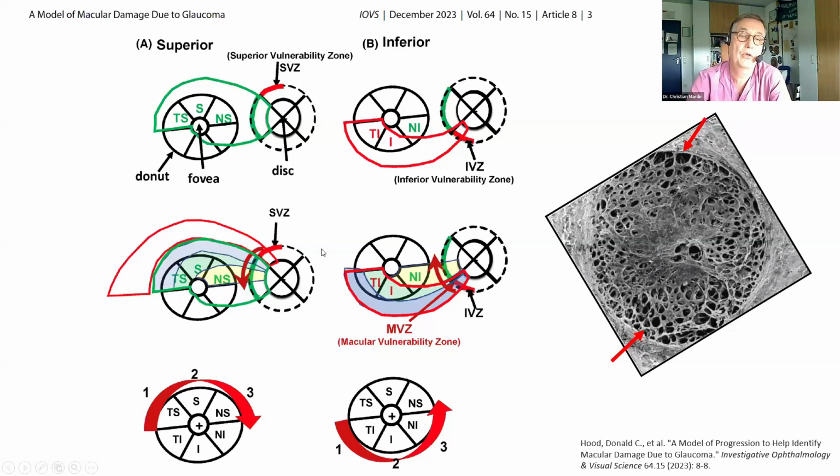And then with progressive disease, these zones are left. Axon loss slowly moves towards the papillomacular bundle, and also the loss of ganglion cells starts to move to the center, as it is nicely imaged here in his graph from his paper.